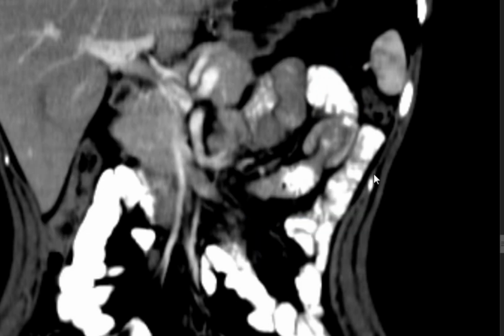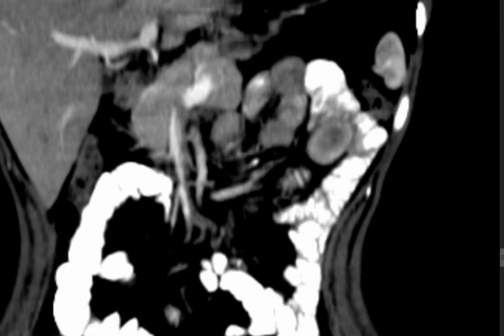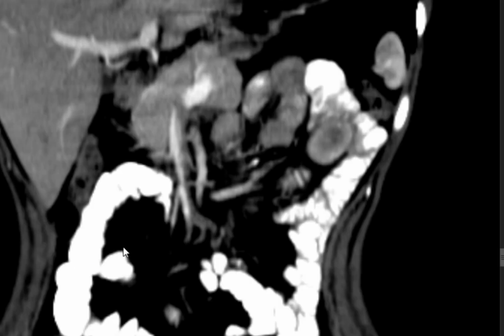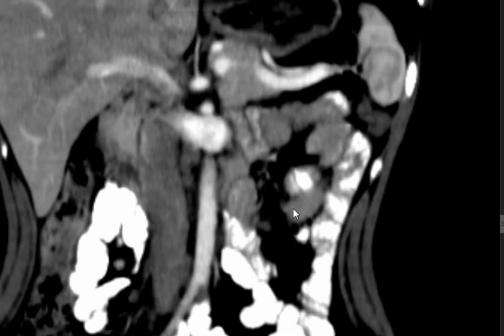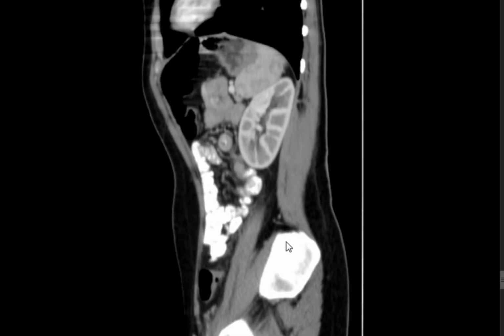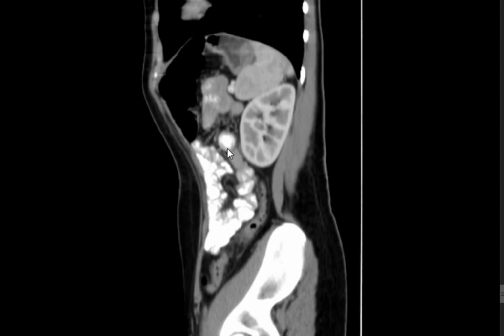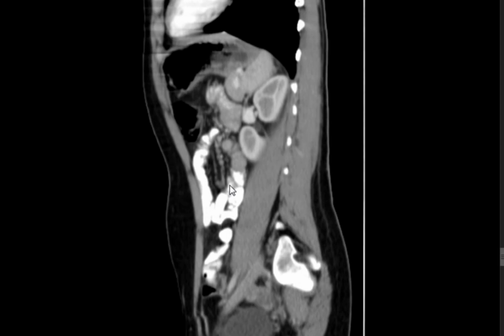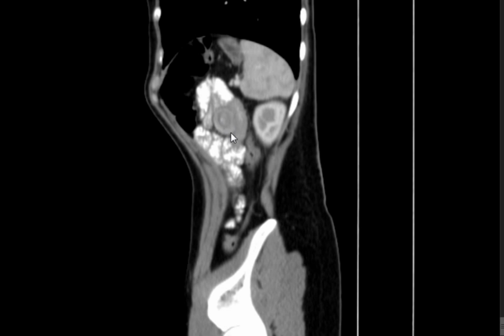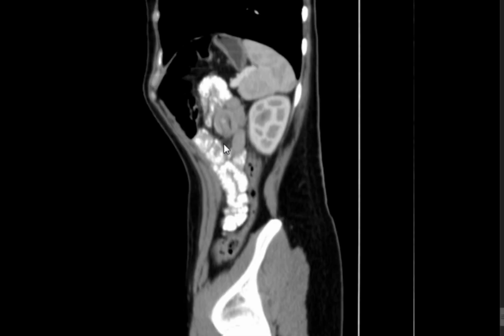Okay? So this is a straightforward jejunal intussusception. And that's why you don't see any signs of intestinal obstruction. Of course, there's no intestinal obstruction all the time. It's just moments. It comes and goes, comes and goes. Yep. Nice.